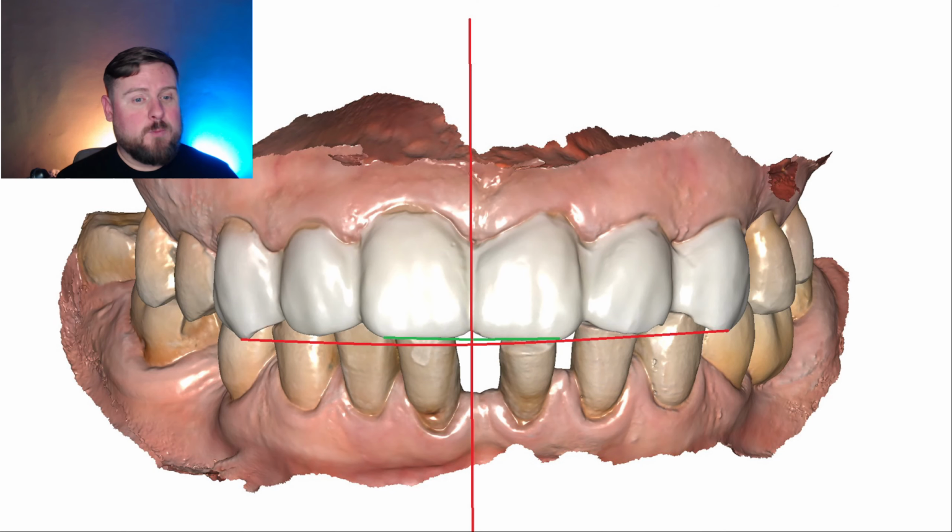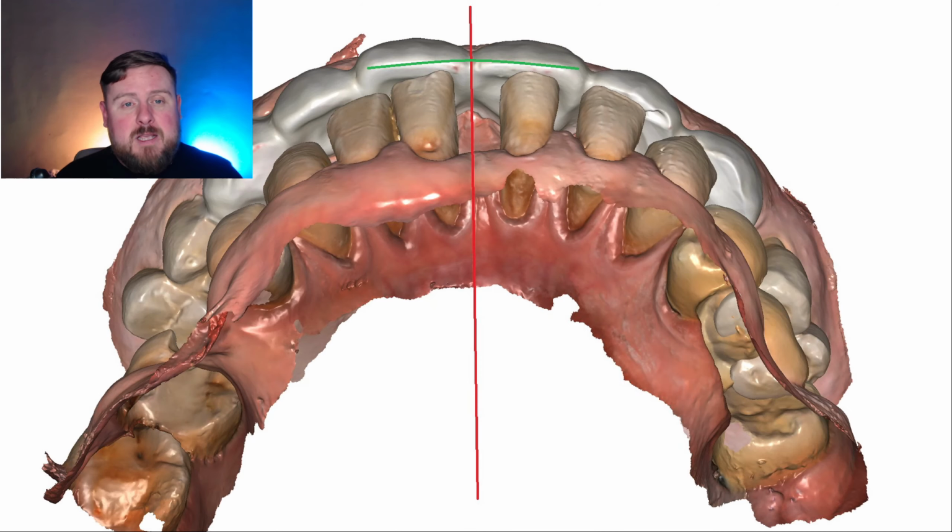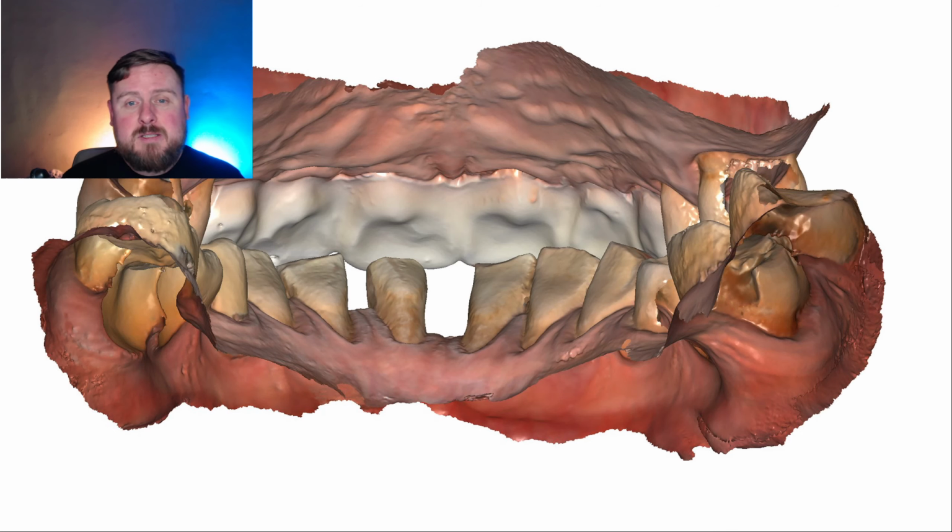So the teeth have some wear. You can see some guidance pictures. Please make a nicer midline, the center. And all those shapes of the teeth are very rounded because it's a mock-up. It's a mock-up with thermofoil in the patient's mouth, and it's not very nice. And as you can see, some lower teeth are protruding too much. You can remove a little bit. You will find guidance because all the teeth will be prepared for crowns and big inlays and onlays.